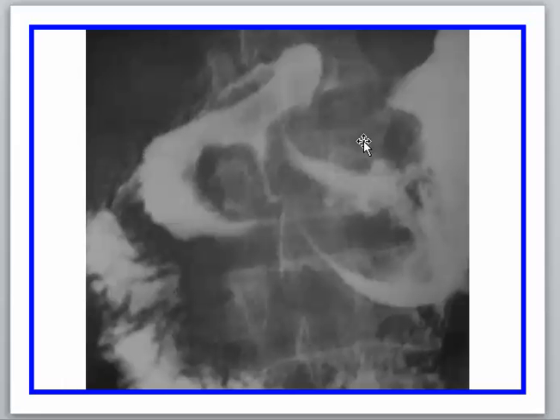Sometimes we get a lesion like that, starting in the pylorus, reaching into the region of the cap, and as seen here, only a tract in the middle and irregularity on either side. So it is similar to the apple core appearance, and of course this is an annular carcinoma.